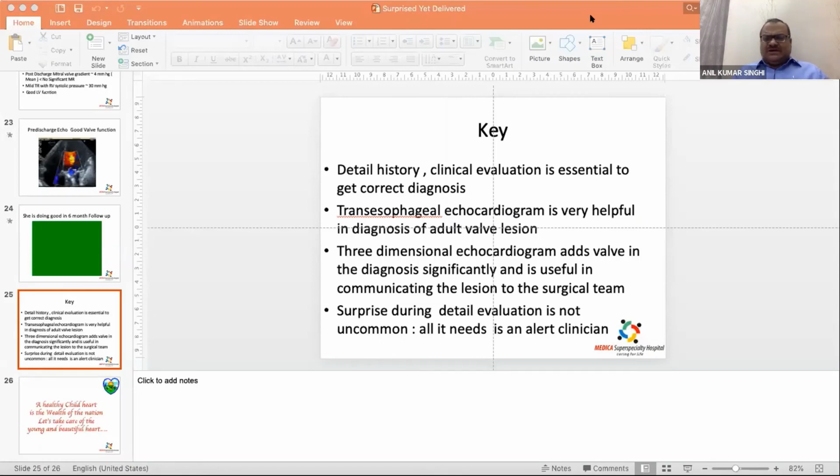Inferior posterior margin, that's the most critical. If it is absent or bald, usually we don't target at all. If it is floppy and small, yes, with operator expertise, with assistance, it can be taken. Superior margin we don't consider as a hindrance in closing the ASD.